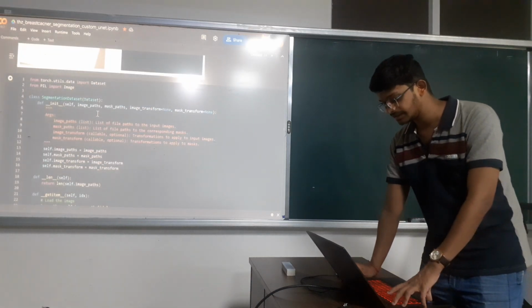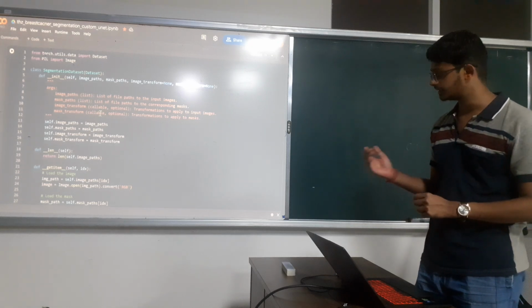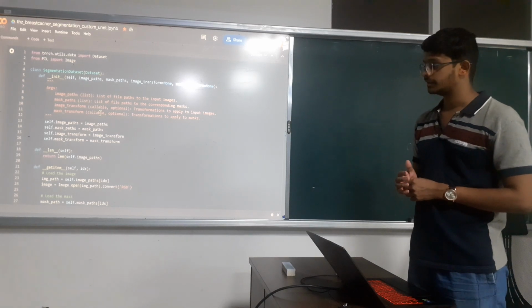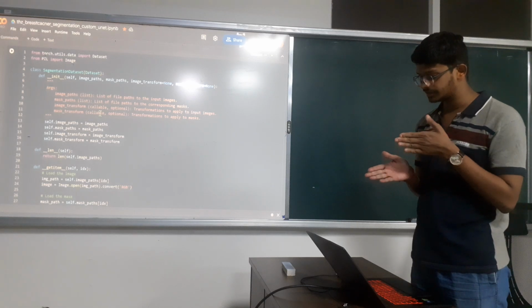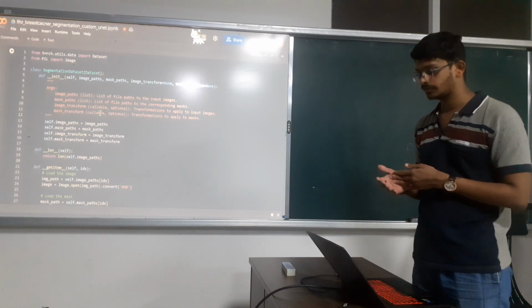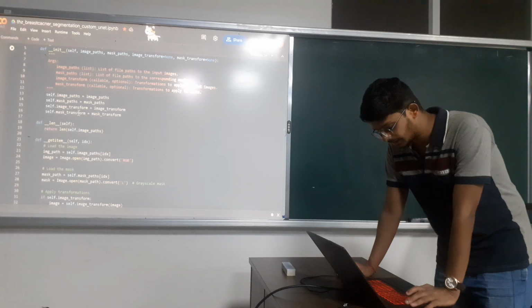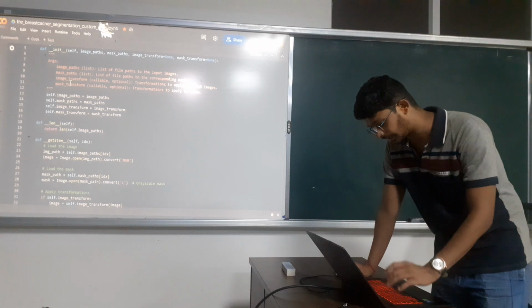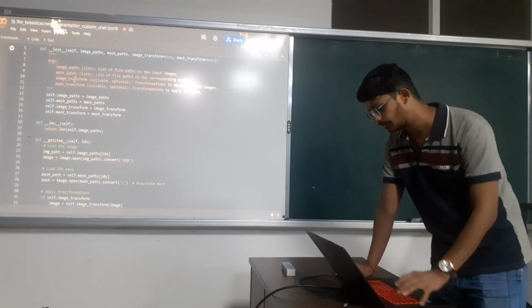Now in this section, before defining the architecture of UNet, or customizing the UNet architecture with the encoder, decoder, and skip connections, I have created the class SegmentationDataset for channelizing all the masks that will be the input for the architecture, along with the transforms for the PyTorch framework, so that there is no workflow default inside the architecture. This is the whole transformation that I have done earlier for the original dataset, and I am doing this again for the masking as well.